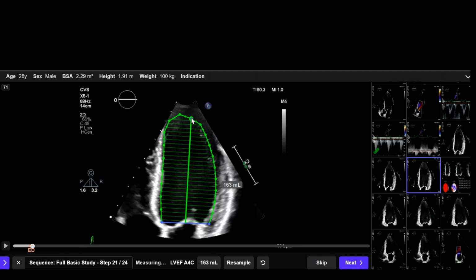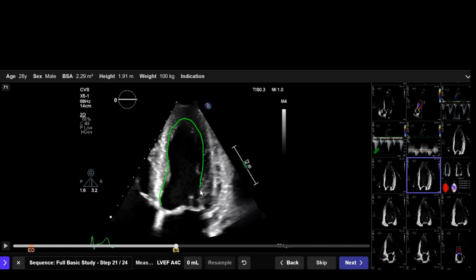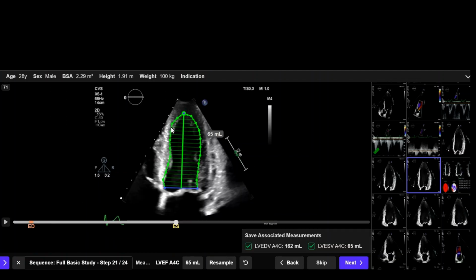And then I can move as required, and then come through to get to my appropriate frame again, and then in this case I'll drag, go like that, but I might come back and then adjust and alter various points if I so want.